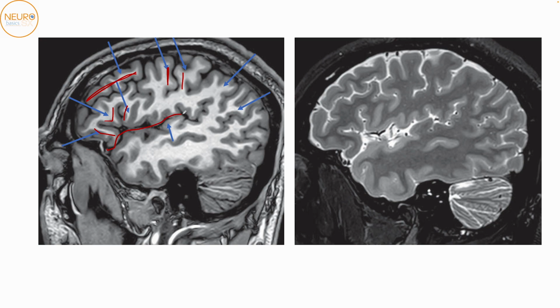The Sylvian fissure will go and end posteriorly into the supramarginal gyrus. So this is the supramarginal gyrus. Just anterior to the supramarginal, you should have the postcentral, and then anterior to that, you have the precentral gyrus. This here is the angular gyrus. This here is now formed the Heschl's gyrus. The superior temporal gyrus, middle temporal gyrus, and inferior temporal gyrus over here.